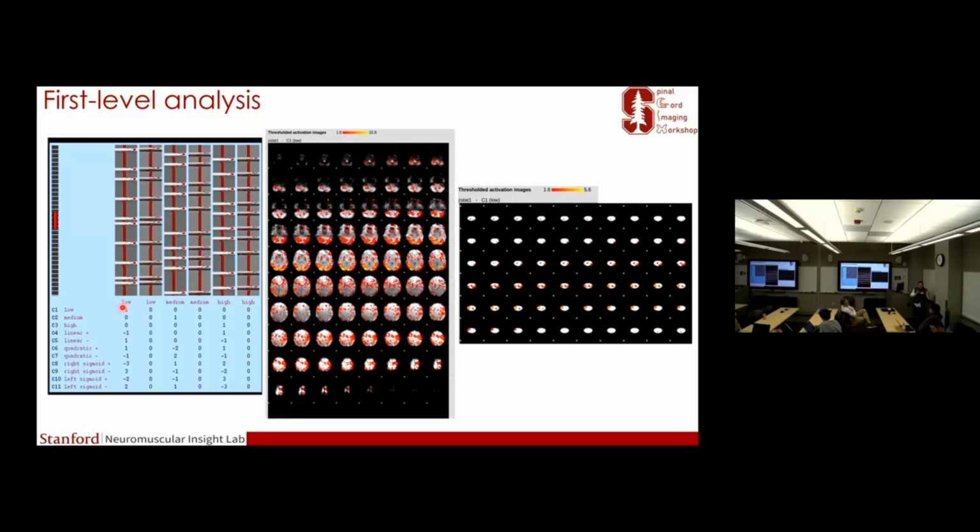This is why we first denoise the images in the native space, and then we bring them to the template space, and then we use the template space images for further analysis. This is why we don't do everything within one pipeline, because our noise regressors are in subject space. Which FSL tool does that, regressing those? FEAT. Basically, it's a GLM model that you just regress the noise out.